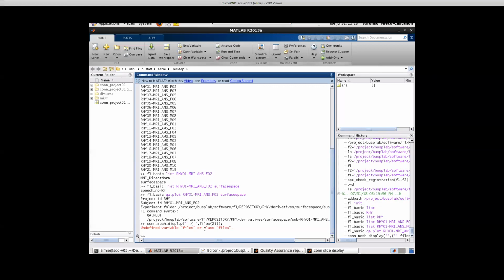So sure. Or having the opposite. I mean, having the FS average space, but projecting the actual subject-specific curvature information onto that file to get a sense of... I don't know. I'm trying to come up with which plots are actually most useful to detect which type of issues. If the problem is the potential miscorrelation between anatomical features for that individual subject, that might be more easily detectable if we are looking at the actual curvature information on an FS average space or something like that. Wouldn't you think?